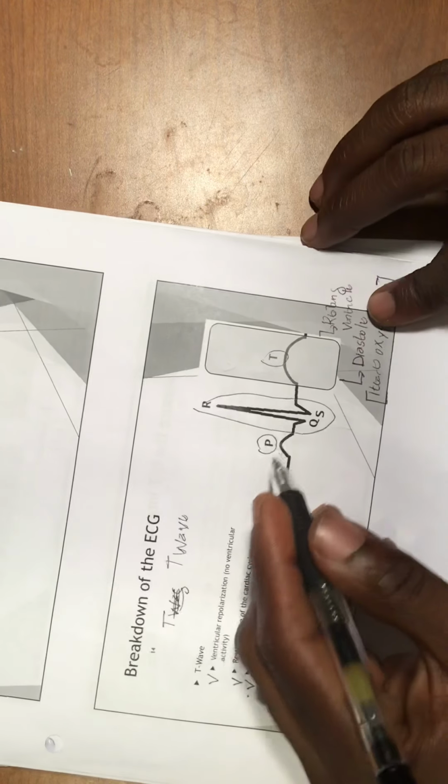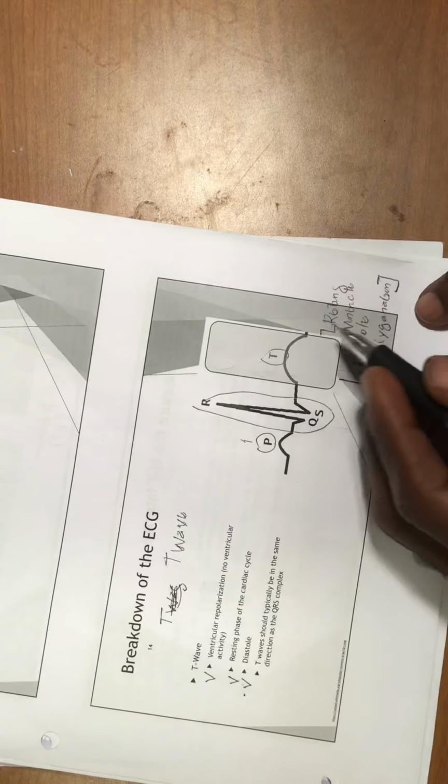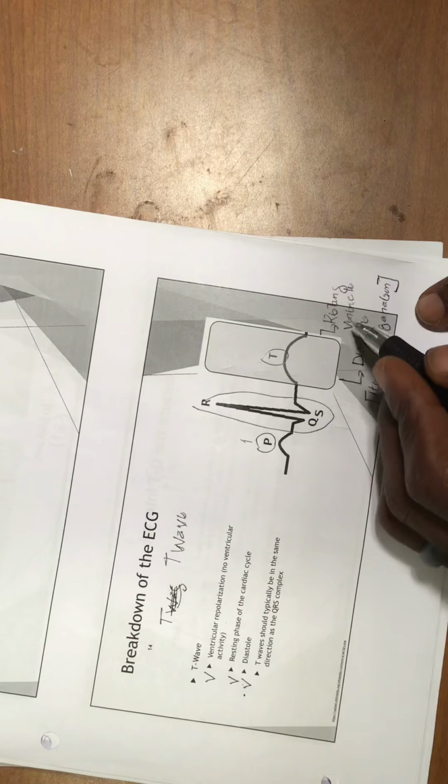When you are reading an EKG, you're not going to see a U wave in the representation of an EKG. If I can go back and show you something again right here, this is the main representation of it. You're going to have a P wave, the QRS complex, and the T wave that I was telling you about. They represent the resting, where your ventricles are resting, or your diastole, when your heart gets its oxygenation, because your heart eats in diastole.